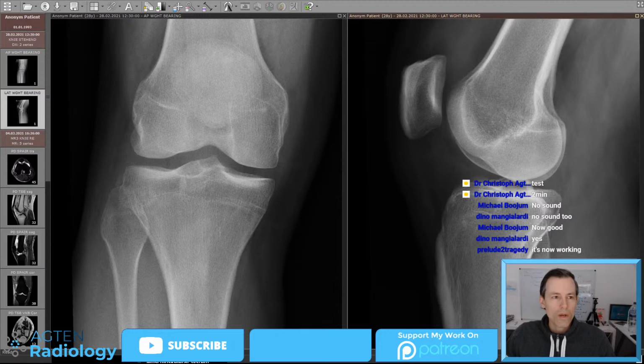Very good. So I think I will do about maybe half an hour, maybe 1 hour. We'll see how it goes and how much I can actually tell you about this case. Now let's start right off here.